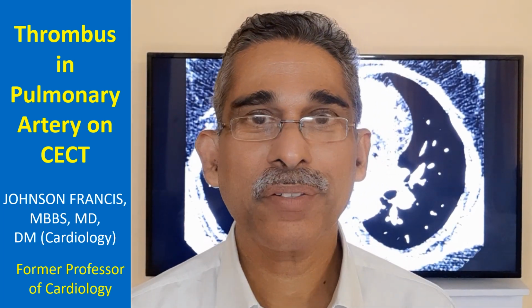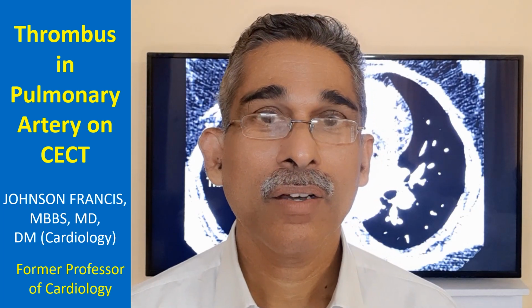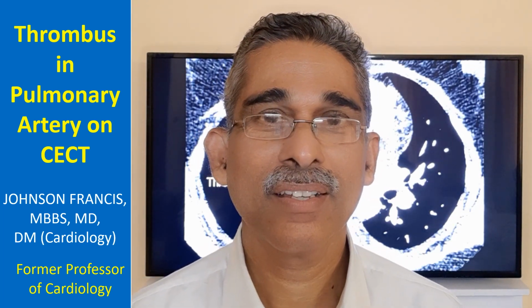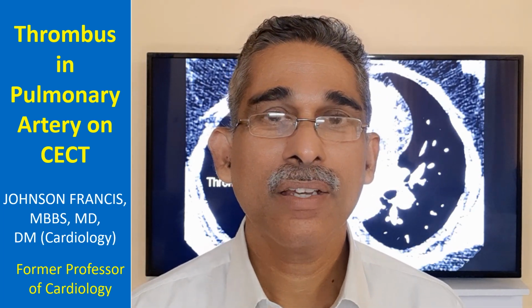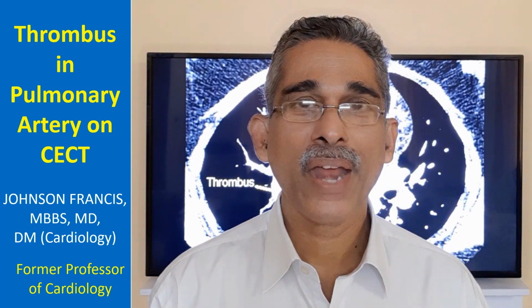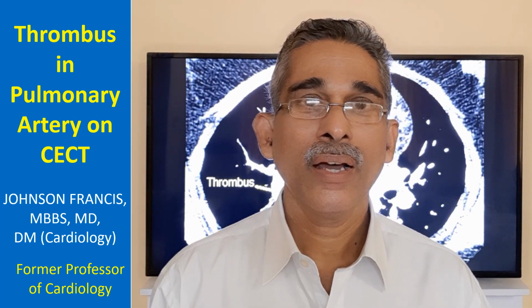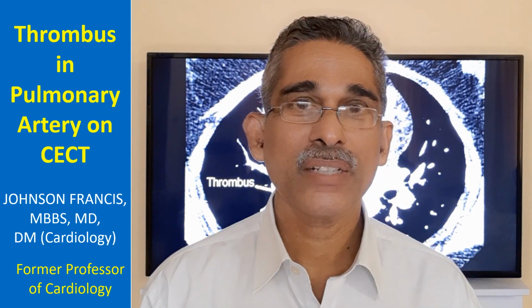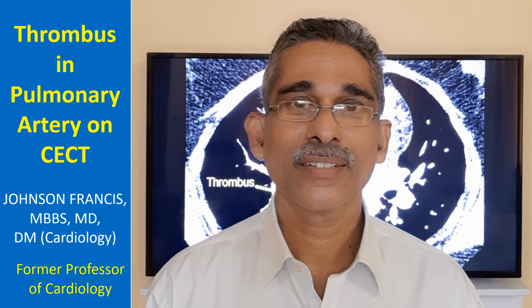Now I am going to demonstrate a thrombus on contrast enhanced CT scan of the thorax. You know that CT pulmonary angiography is now the gold standard for the diagnosis of pulmonary embolism. Occasionally you may be able to pick up a thrombus in transit in the right heart chambers or main pulmonary artery, but that's a very rare occurrence.